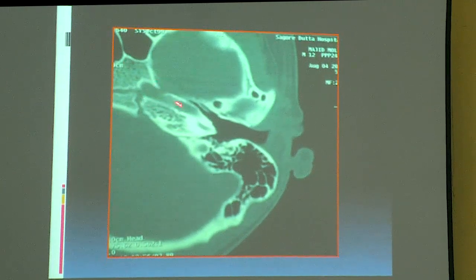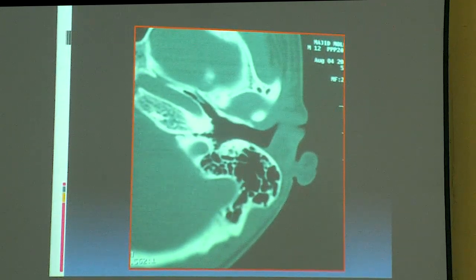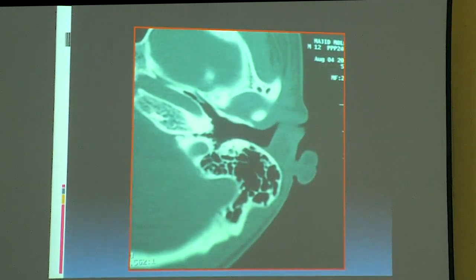And here you start to see the horizontal carotid artery, right? So if we start from the neck, where is the carotid artery dividing? At the level of the hyoid bone, right? So the external marking is at the hyoid bone. So you have the parapharyngeal carotid.